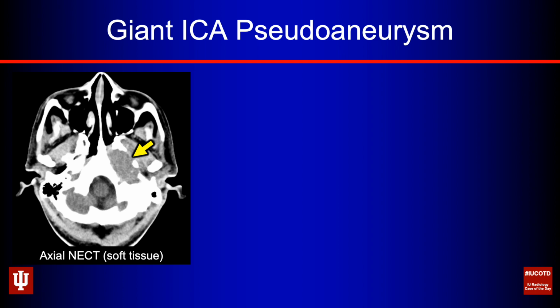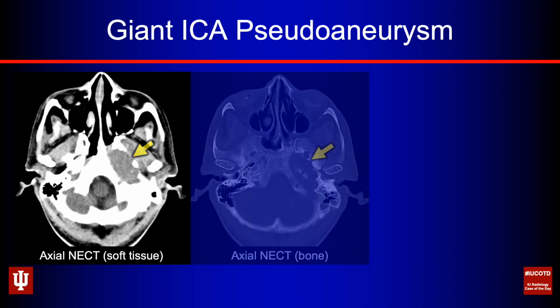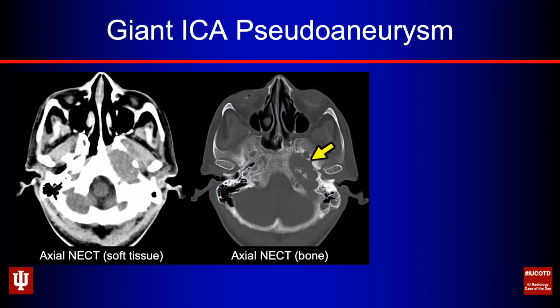Something's going on here. This is a classic SGO, right? We've got this soft tissue. It's at the skull base. It just doesn't look right. Don't think this is volume averaging through your muscles of mastication, your pterygoid there. So look at the bones. Oh, that's not normal. We sort of have this remodeled, sort of eroded out appearance of the skull base.